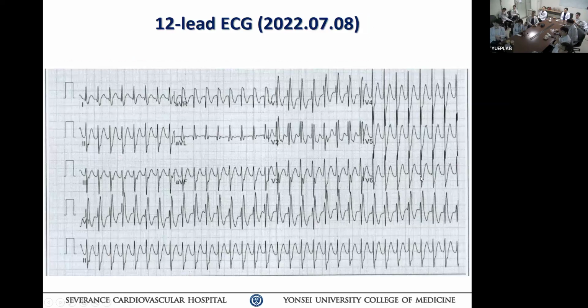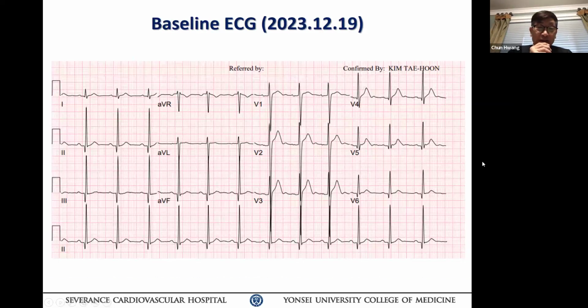Just hold a second. Go ahead and read your ECG. Is it normal for young guy this ECG? Yes or no? That's the first thing we need to know, right? 이 환자 뭐가 굉장히 클리어하게 보여요? EKG? You got nice T wave. After that, you have a biggest hump.